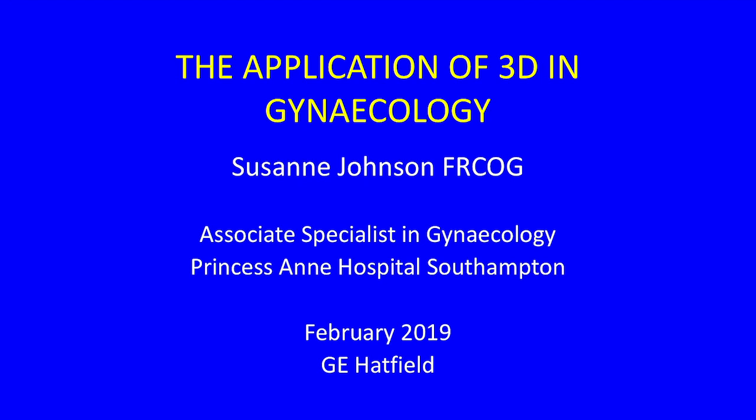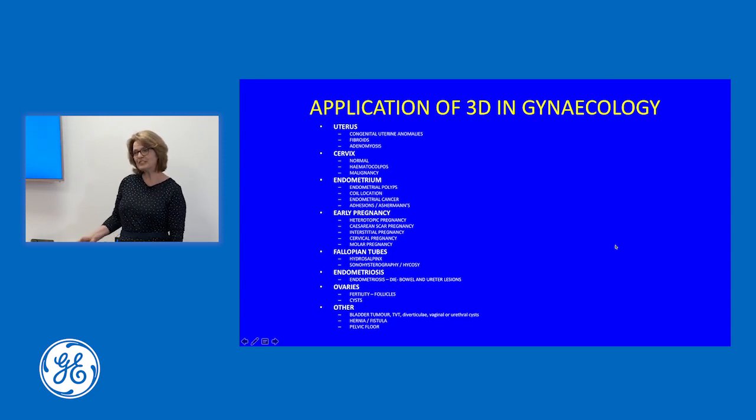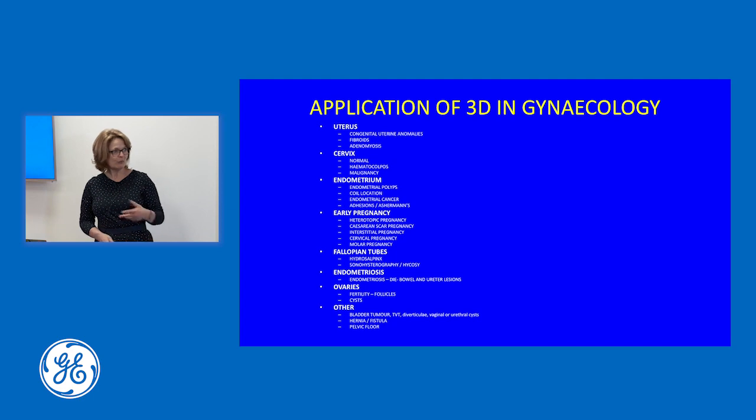I've been asked to give you a talk about the use of 3D in gynaecology ultrasound so that you can see what I do with 3D. These are all the different areas within gynaecology that I have used 3D on, and I will show you examples of all of these.